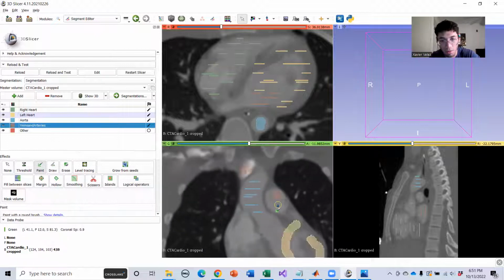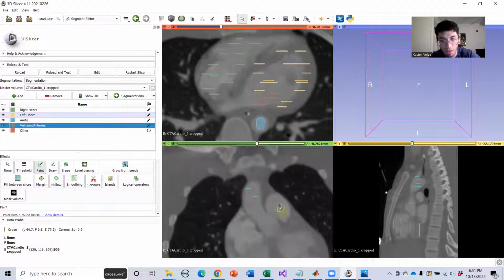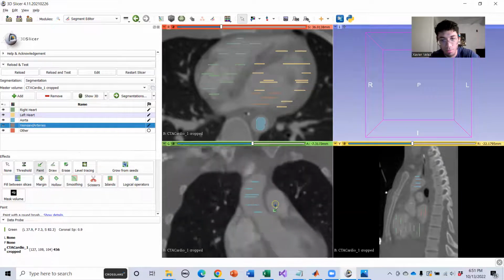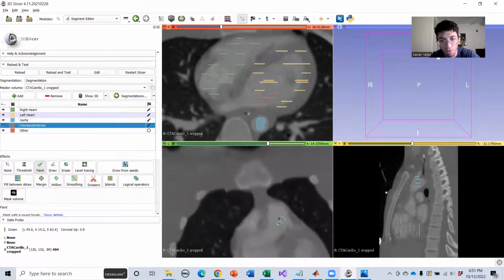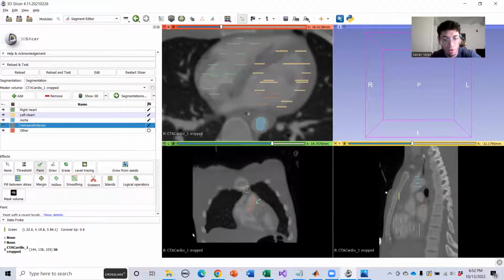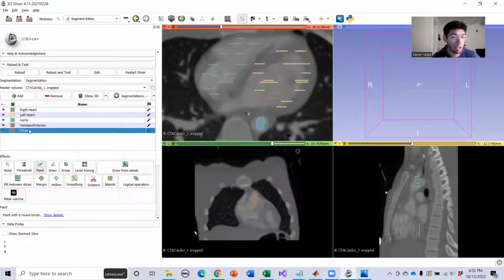And maybe I'll draw a little on here, as it moves inward there, right? Sweet. Okay, so those are our 4 parts.